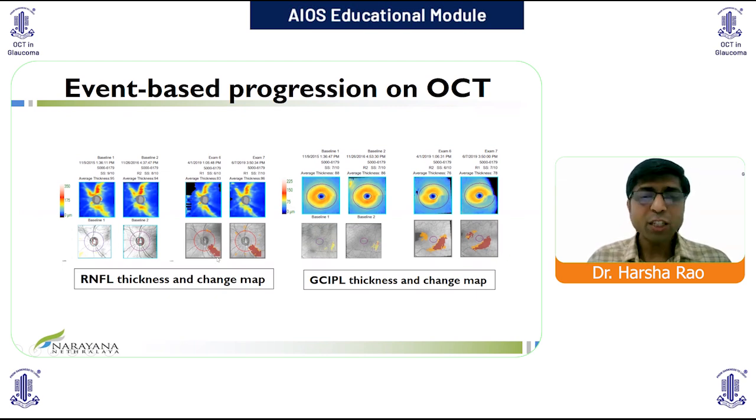The variability is once again determined by the machine itself, and the significance is also dependent on the region over which that change is happening. If it is too small, it is not highlighted, but if it is happening over a 20 superpixel region, then it is considered significant and is highlighted in the color region.